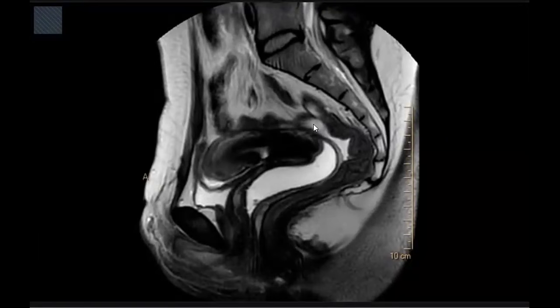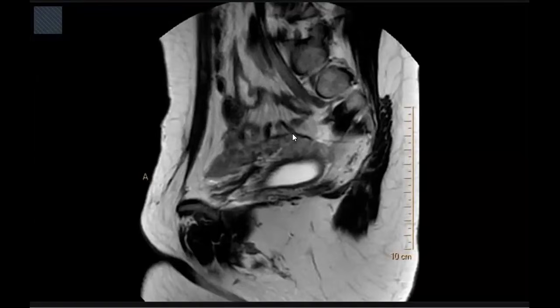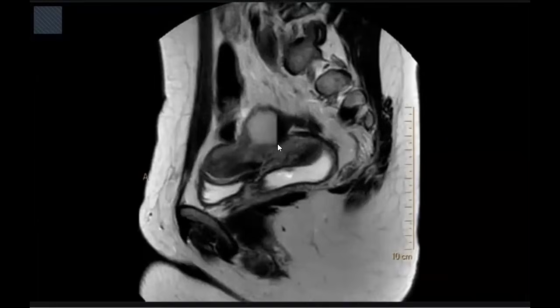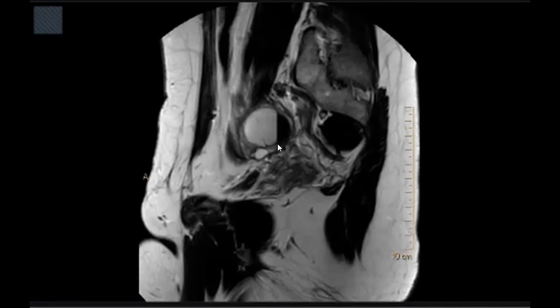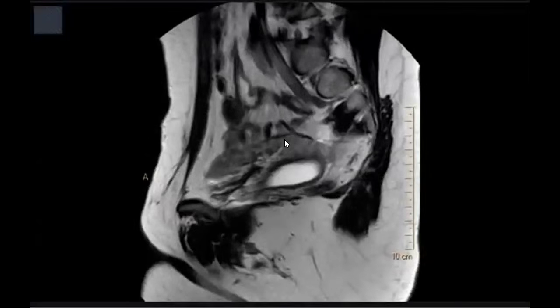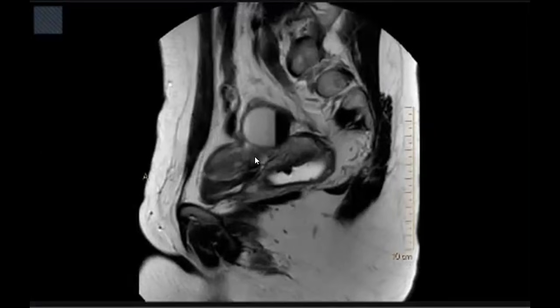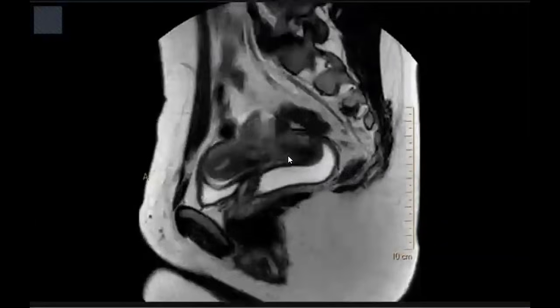Which plane is the long axis in this case? For the other cavity, he would take perpendicular to the long axis of one of the cavities, and I'm not sure about it.